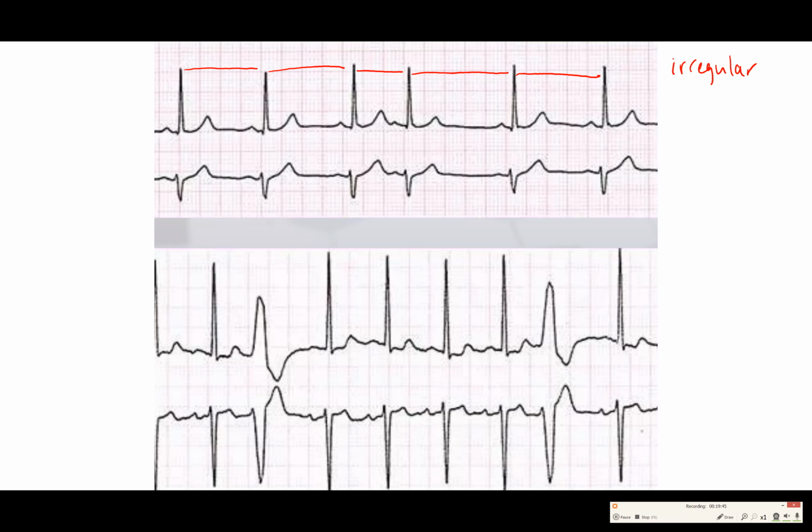Okay, so then we're going to go through our P wave questions, right? We have 5 of them. First question is, are there P waves? And we would say, oh, that looks like a P, a P, a P. That's probably a little P there too. Right there. P wave, P wave. So we would say, yes, there are P waves too.